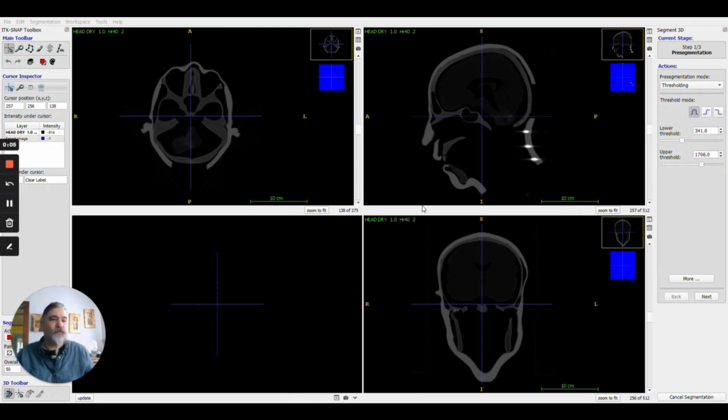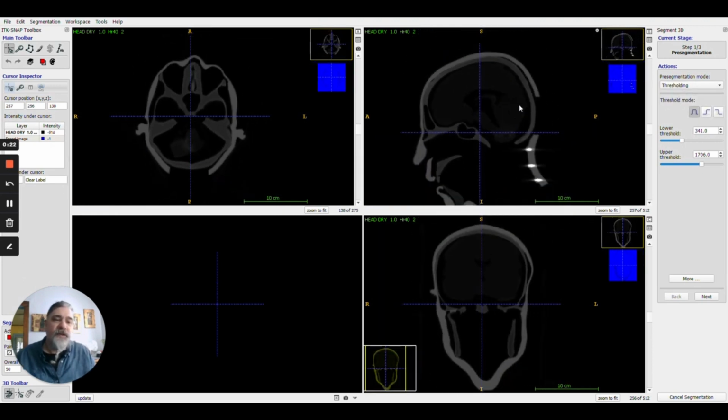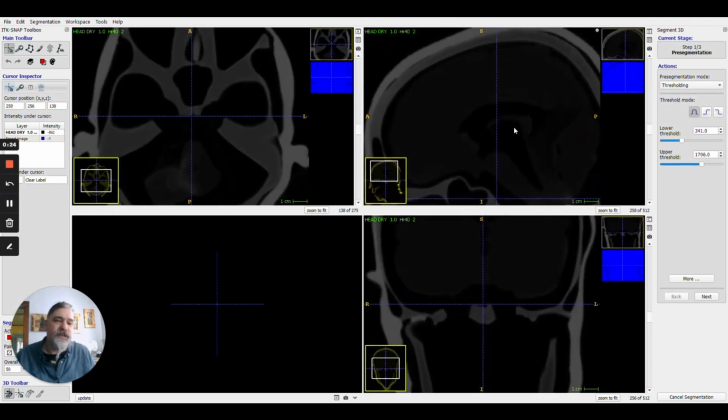Of course, we're going to take a moment to discuss segmentation using the classification tool. So, first of all, I'm going to zoom in a little bit using the right mouse button. And what we can do is select general areas based on value.